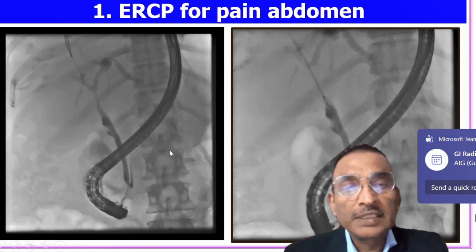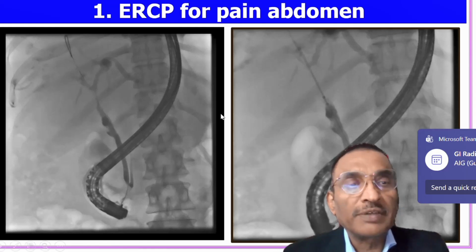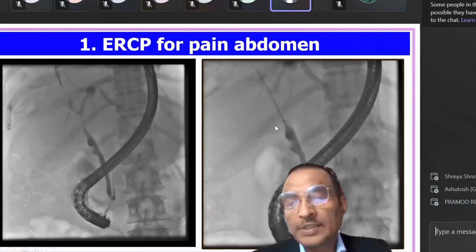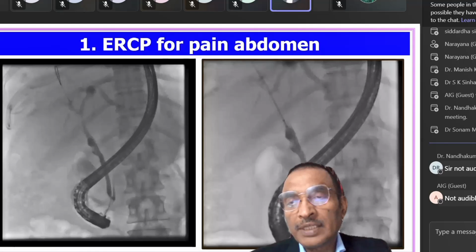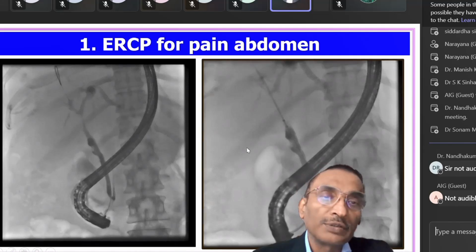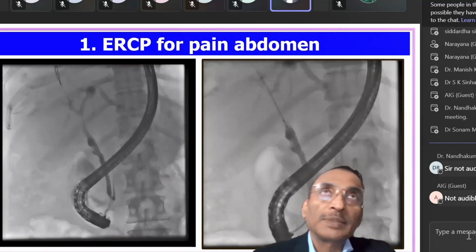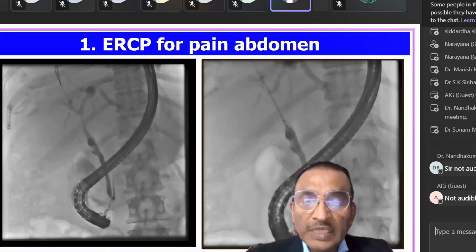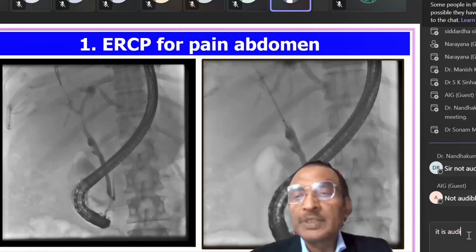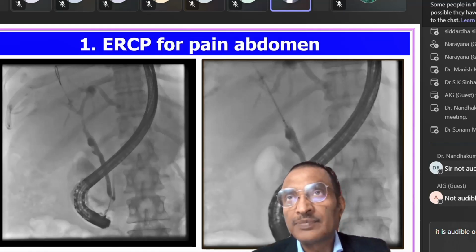and then the positive findings. One small point which is not relevant here, but you should always see beyond the covered screen, sometimes in the blank area, sometimes beyond the area of interest. Also, there are very important findings. As we go, I will show you somewhere. Sometimes what happens is that you have done a chest X-ray and there is a calcification lying in the axilla. So that should not be missed. Or on an abdominal X-ray, there is a calcification lying in the inguinal areas. So that should be very important.